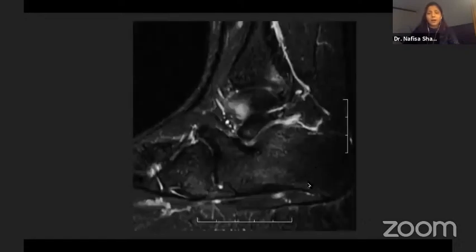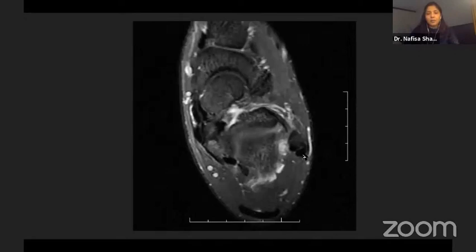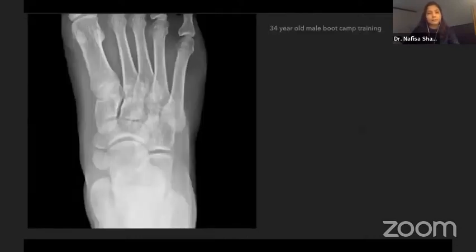This patient, apart from the coalition, also had pain on the lateral side. You'll see that there are some areas of stress edema. This patient has a flattish arch, and there's a bit of free fluid around the plantar fascia. As we looked at the axial imaging, we can see that the peroneal tendons were abnormal. They had high signal. The peroneus brevis is thickened, it's tendinotic, and it is developing a longitudinal split tear at its inframalleolar course. So there's additional information that the MR is giving you in this case.